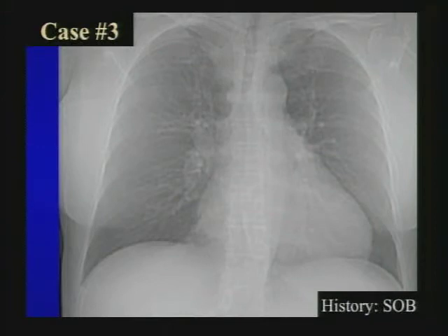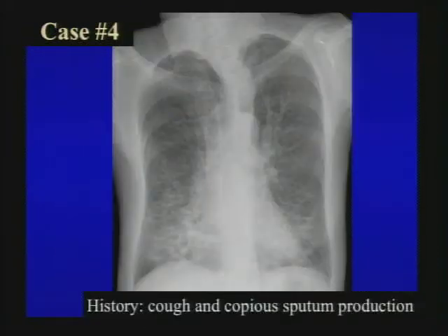I think radiologists like some of these patterns because they have this bizarro differential. We love to torture medical students and residents and fellows. Notice the abnormality is pretty extensive. Another good one, copious cough and copious sputum. This is another sort of radiology classic, but certainly has a differential of a kind of a bunch of bizarro things.